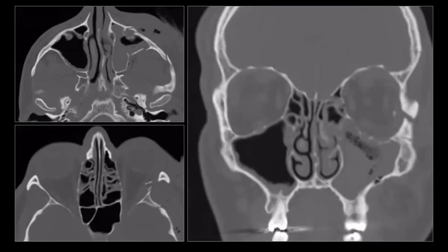Then another type of fracture, this looks like a complex fracture. And if you're dealing with complex maxillofacial fractures, it's important to keep it simple by trying to look for a specific fracture type. In this case, let's first look at what components of the maxillofacial structures are involved. This patient has a fracture of the anterior maxillary sinus wall and the posterolateral maxillary sinus wall, so the maxillary sinus is involved. And then we have a fracture of the zygomatic arch, also of the lateral orbital wall, which is composed of zygomatic bone and the greater wing of the sphenoid, as you know.